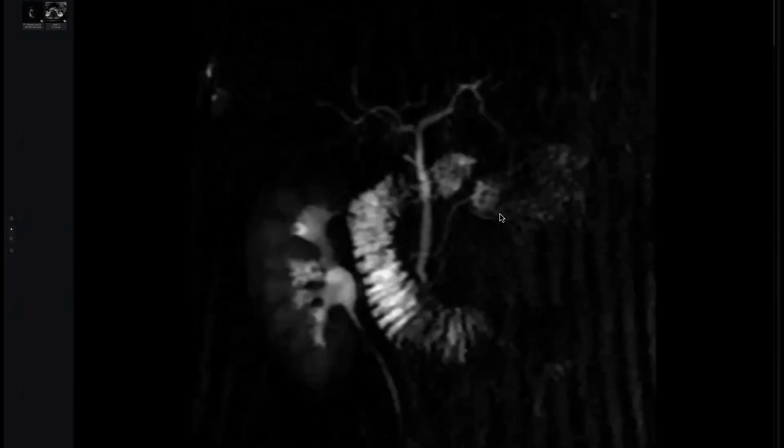In our last session, I gave one candidate a normal CT, completely normal, and he tried too much to pick up any signs. I'm waiting for him to tell me this is normal. I want MRI because the patient has clinical significance. Also, here the patient has recurrent abdominal pain.